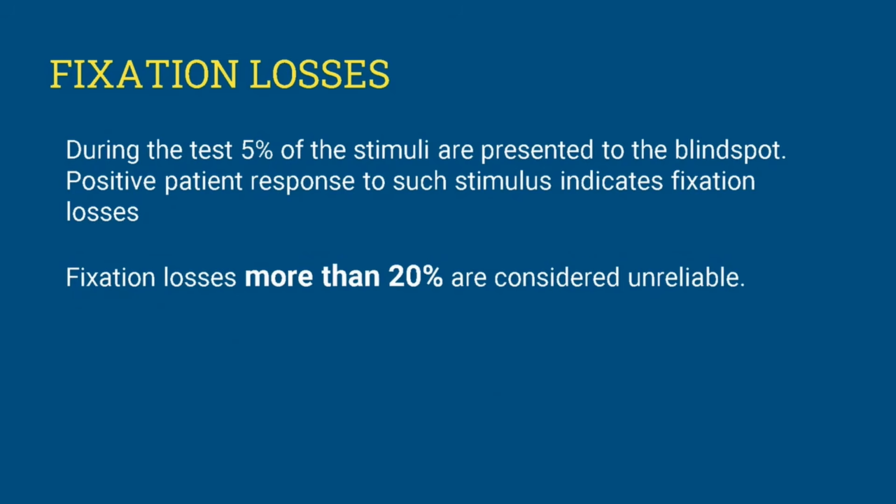Fixation losses. During the test, 5% of the stimulus will be presented to the blind spot. If a patient response is positive on such a stimulus, it indicates fixation losses. Fixation losses more than 20% are considered unreliable.